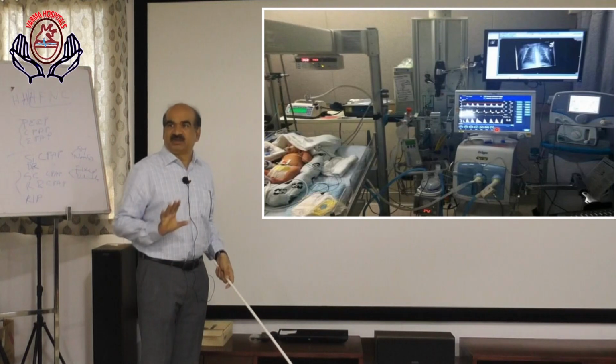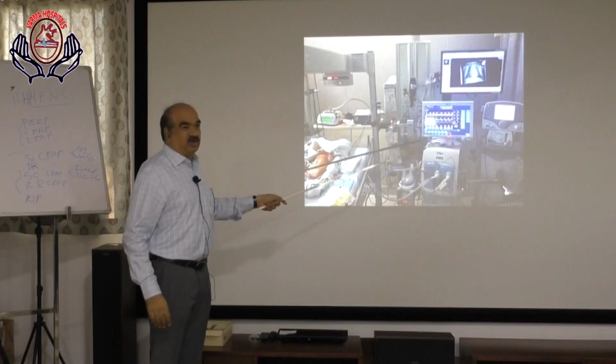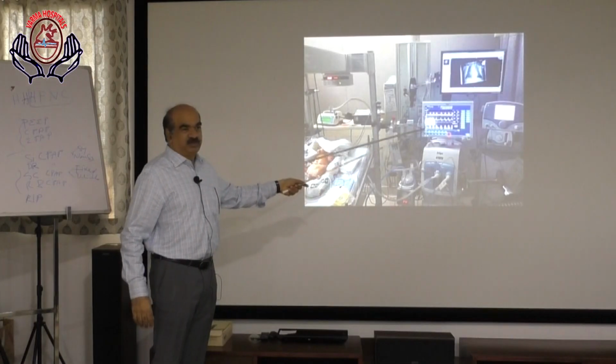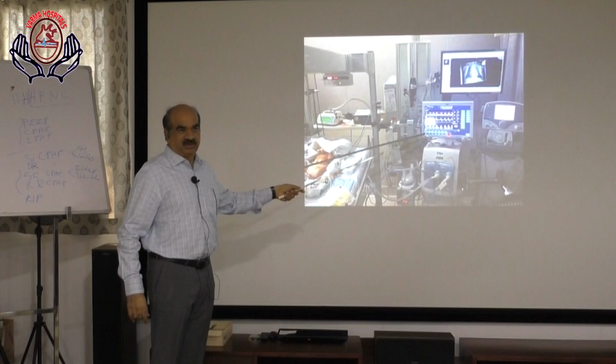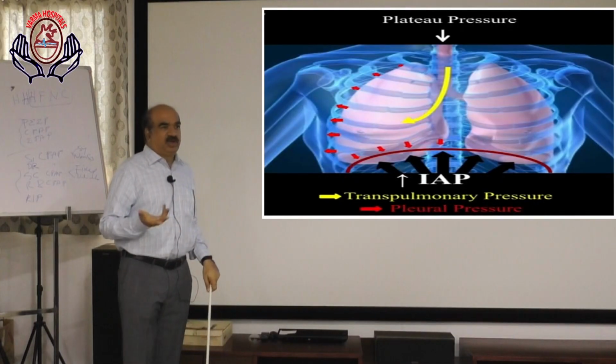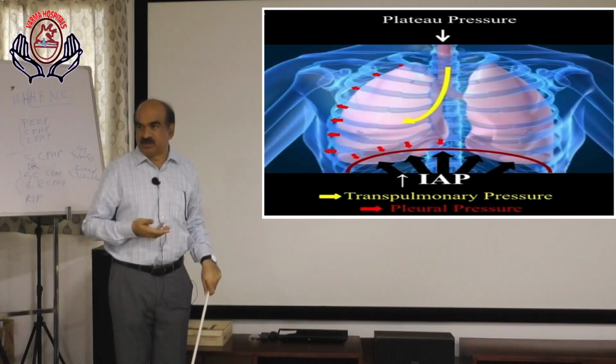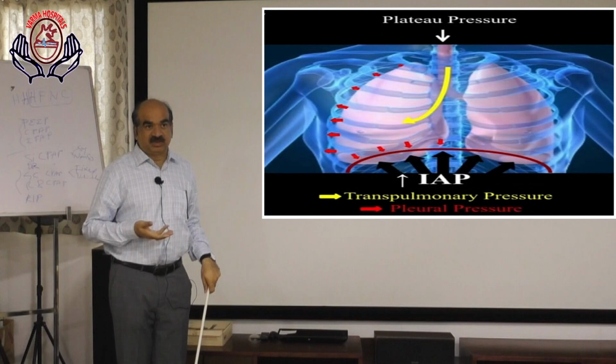That is only 1%. 99% of the time, for continuous monitoring of the patient, these ventilator graphics are important. Okay? Because in X-ray, we don't know about pressures. We don't know about peak inspiratory pressure or even plateau pressure. We don't know about transpulmonary pressure, pleural pressure.